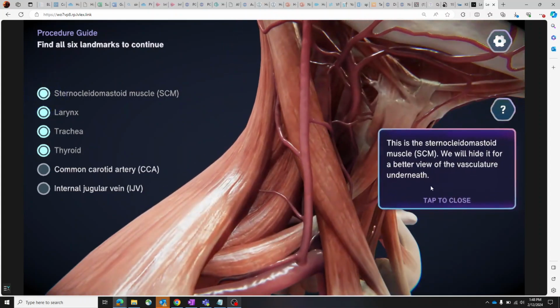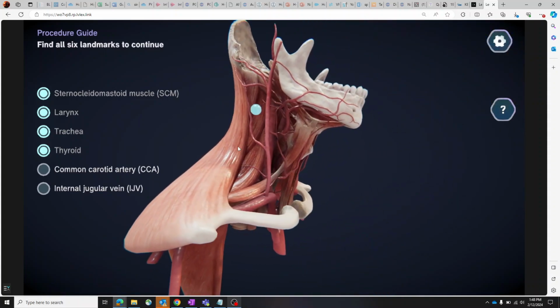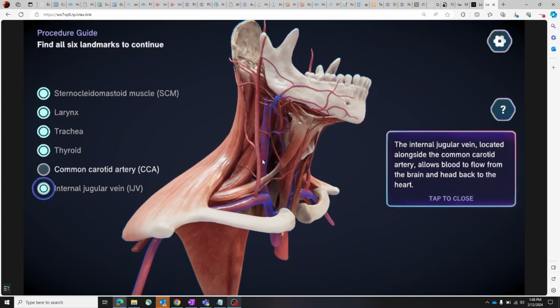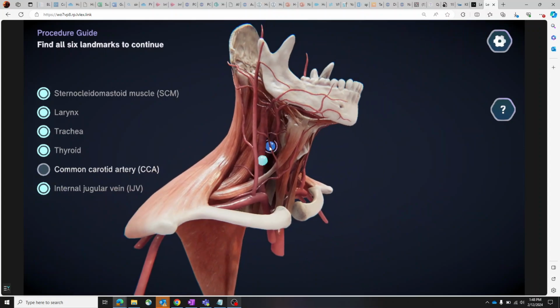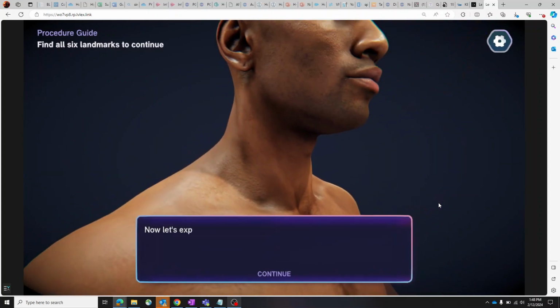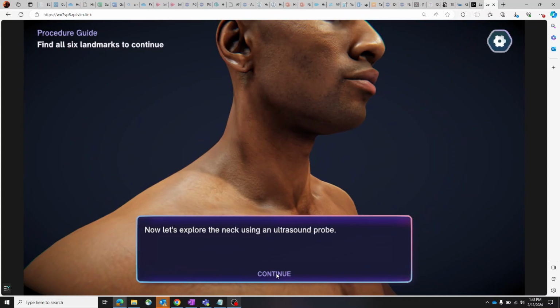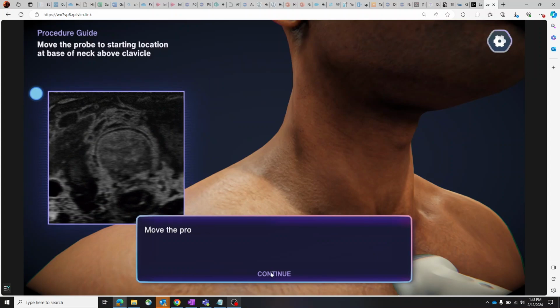We're going to turn on color Doppler. So this is the representation of what to expect when you see color Doppler. Drag the parallelogram onto the screen, and you'll see the color on screen afterwards. The scan simulation templates are designed in a way that use a figure guide and act as a follow along.